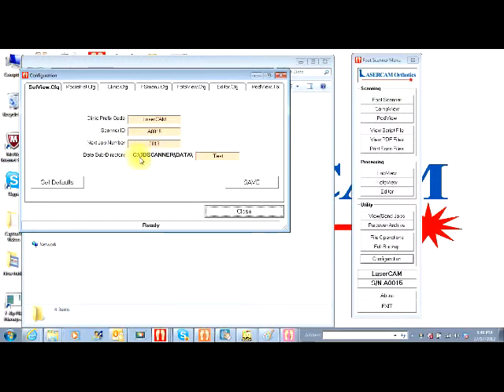The subdirectory that I put everything in is C drive, 3D scanner data. In this case, I put things in the test directory. If I'm setting up a podiatrist and it's Ride, it'll be 3D scanner data and Ride. That's where they have to put their VRML files when they come off the scanner. If they save them to that directory, the program then picks it up directly.